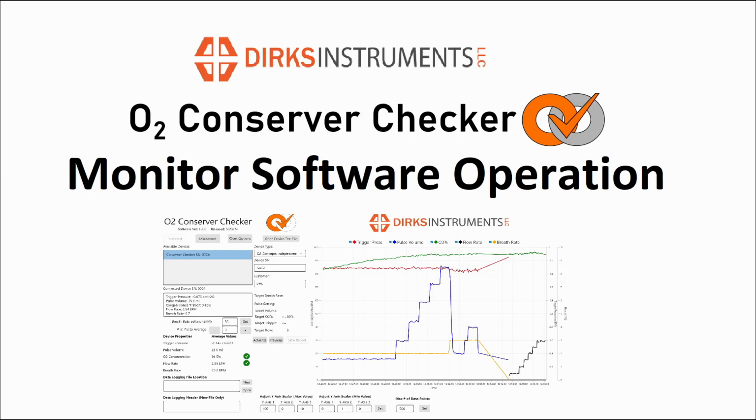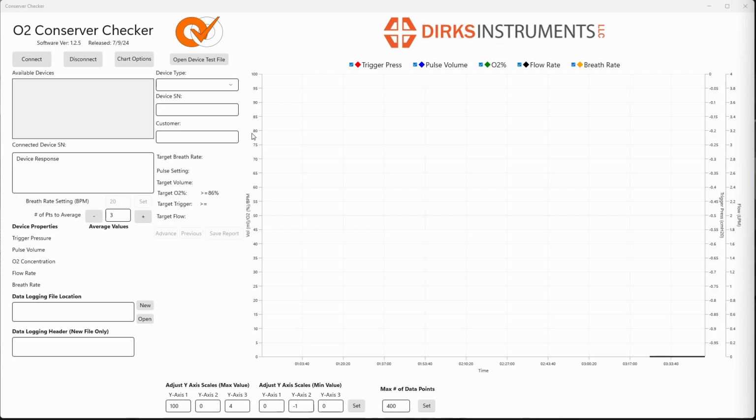Hello, today we're going to be looking at the basic functions of the Conserver Checker monitoring software. When you start the program, you'll be at the home screen. This is the primary screen where all the information will be collected and displayed.